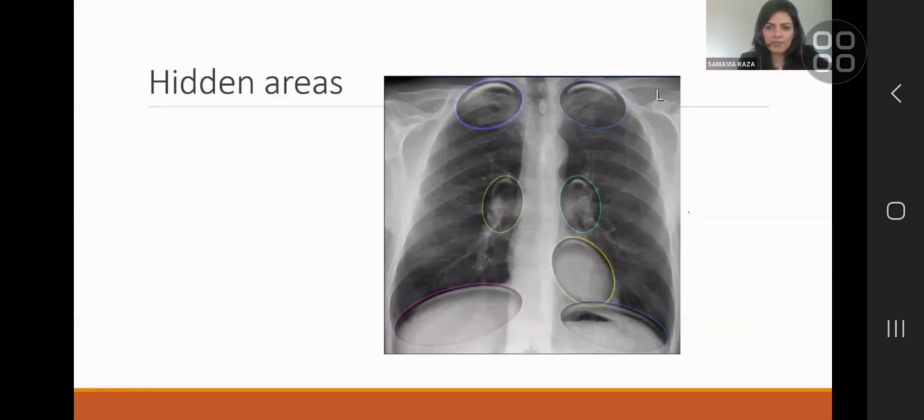And that's where the most significant pathology will sit that will kill the patient if you miss it. It won't kill them today or tomorrow, because the pathology that kills you today on a chest x-ray is very, very visible. The pathology that kills you 2 or 3 years from today is what you will miss. The incidence of lung cancer, unfortunately, is very, very high everywhere in the world. In the UK it is extremely high. It's one of the busiest, if not the busiest and heaviest, MDTs in most trusts.